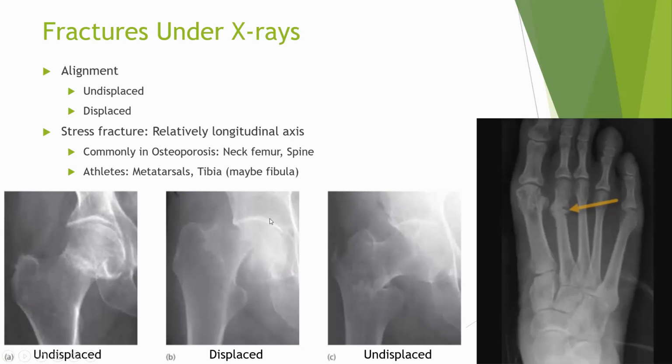And on the contrary, what's there in the middle? It is a displaced fracture. It's a similar neck of femur fracture where the neck is completely superior and posterior. Superiorly and posteriorly rotated. It translated superiorly and rotated posteriorly, as you can clearly note.